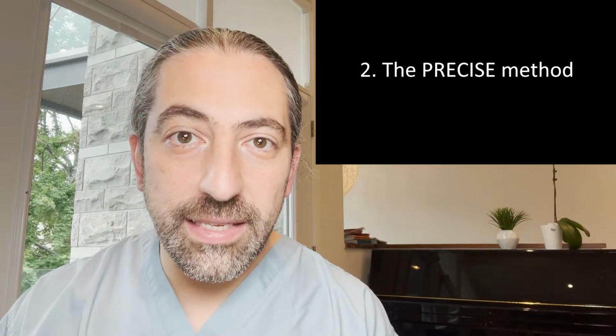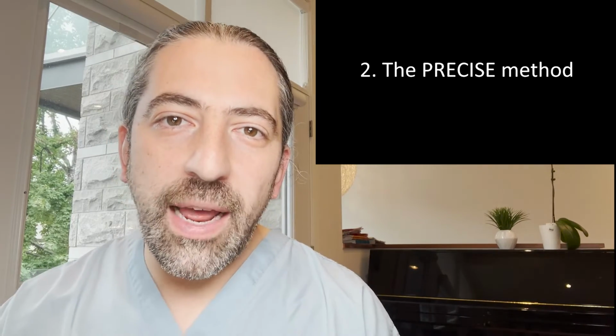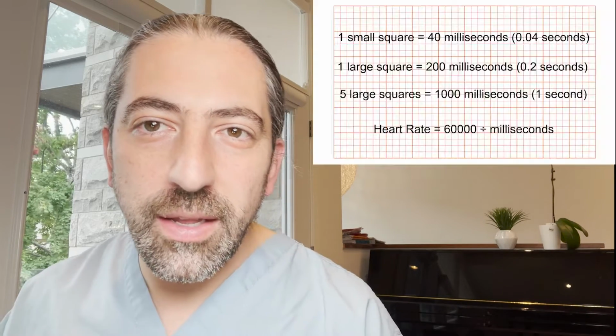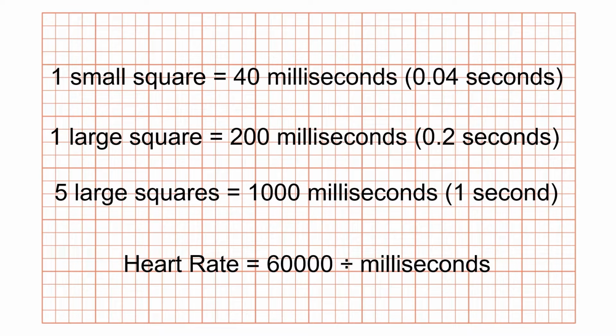The next method is the precise method. If you want the exact heart rate, here we're going to have to actually count the number of large and small squares and figure out how many milliseconds they correspond to. The key component here is 1 small square is 40 milliseconds on an ECG. That's 0.04 seconds. 1 large square is 200 milliseconds on an ECG. That's 0.2 seconds. 5 large squares is thus 1000 milliseconds, which is 1 second.